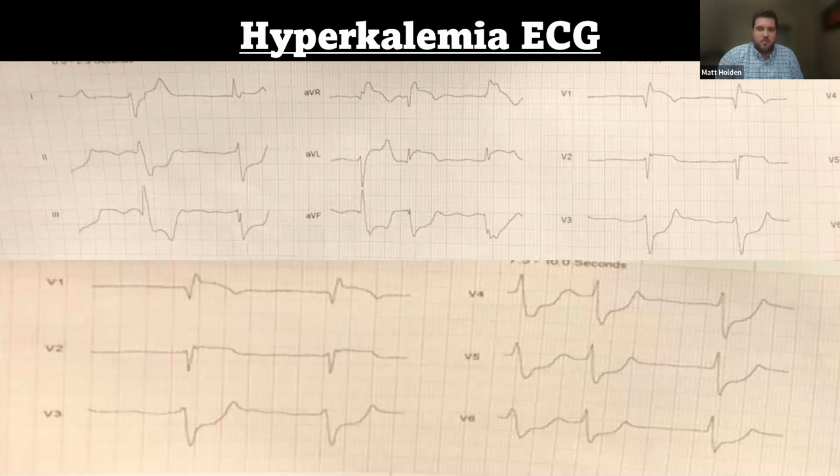So these ones right here have been ones that were sent to me when I was a paramedic, like, hey, is this a STEMI? And I was like, oh no, it's not. Unfortunately, these did have some bad outcomes, but we'll try to learn from this. When you look at this, if you've seen any kind of STEMI, you'll think something about this doesn't look like the right kind of STEMI that you're used to.